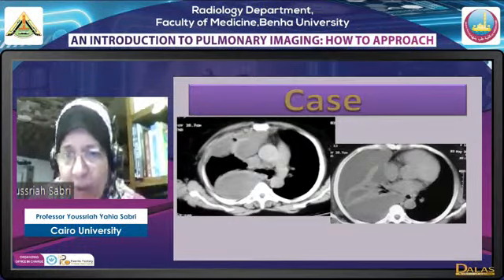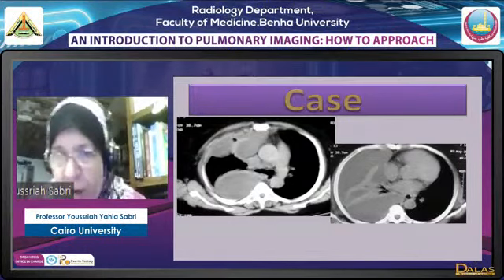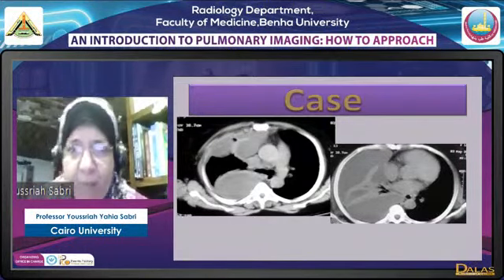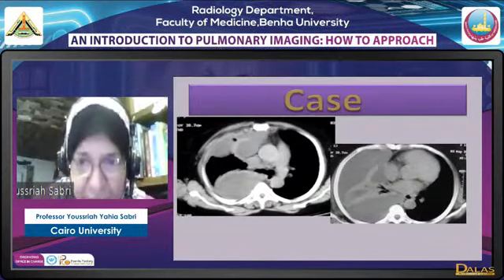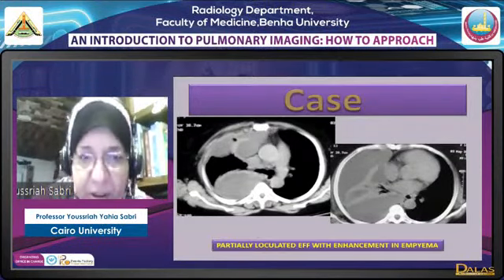And here we have a contralateral shift of the mediastinum. Mark you, if you have total loculation of the effusion, even if it is a massive one, you will not have mediastinal shift, considerable mediastinal shift.